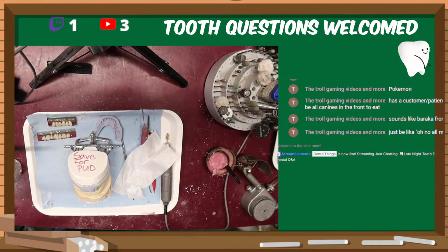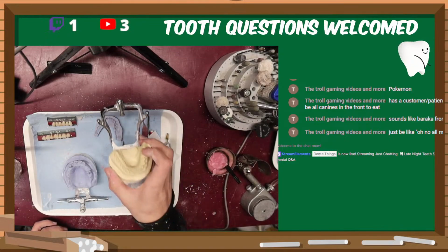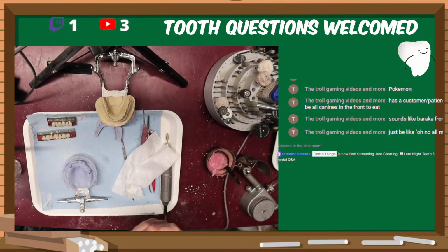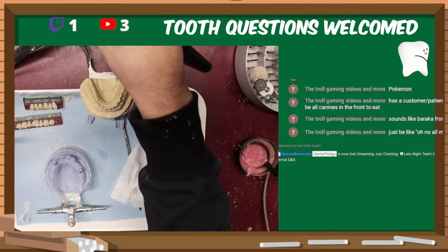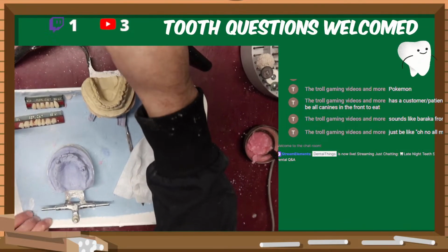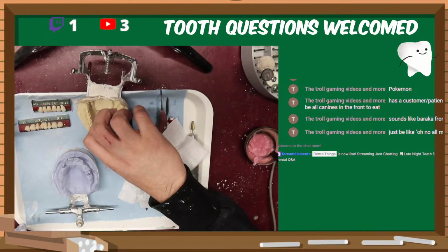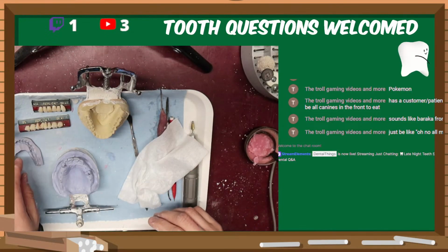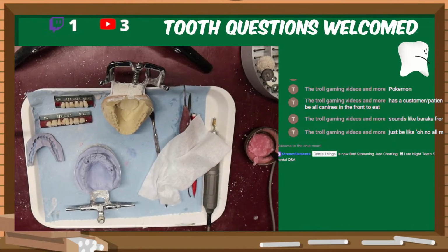what we came here for. And I guess I'll make a base plate for this. That'd probably be nicer. Let me go in. Focus in more on what we're going to be working on here. I don't really need that, but that's just a nice bite wedge.